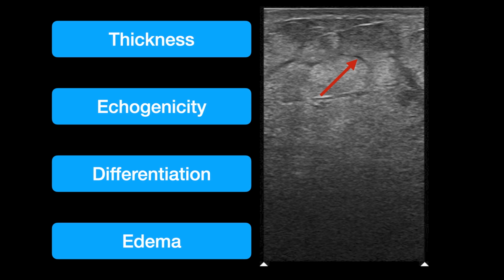The reason for this is a lot of these sonographic findings are secondary to the fluid shifts that happen in inflammation, right? I'm not seeing a bunch of macrophages here. I'm seeing the effects of localized fluid in that area, right? I'm seeing the thickening, those little rivers of fluid, the loss of the marbled echotexture, all that secondary to fluid. And so anything that's going to change that interstitial fluid is also going to give these types of appearances.